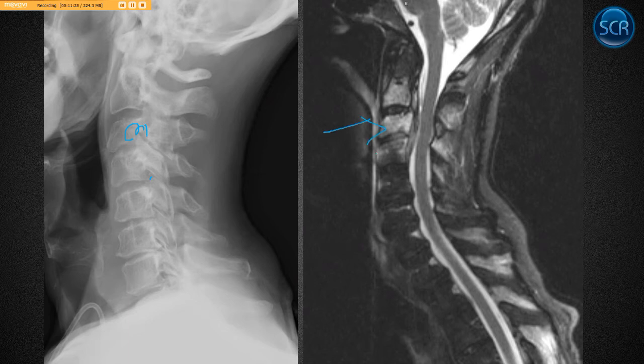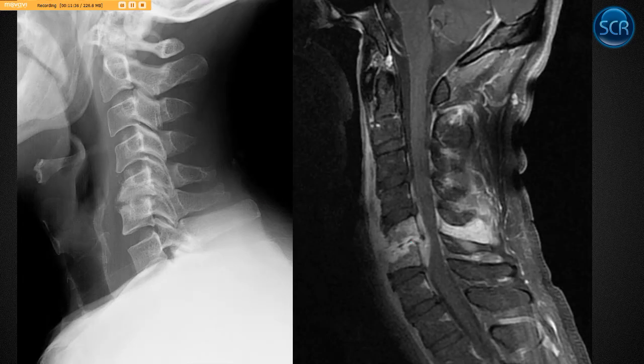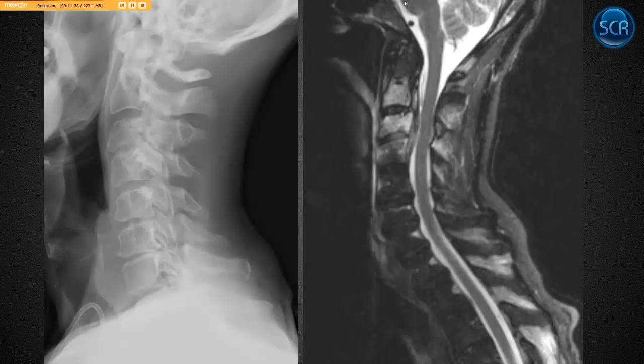And we look at the MRI, and that's what we see. We see replacement of this marrow signal. It's not a disc-centered pathology. The disc here looks good, right? If we compare that to our prior one, this is all disc-centered. If we look at this one, none of this is disc-centered. It's vertebral body-centered.